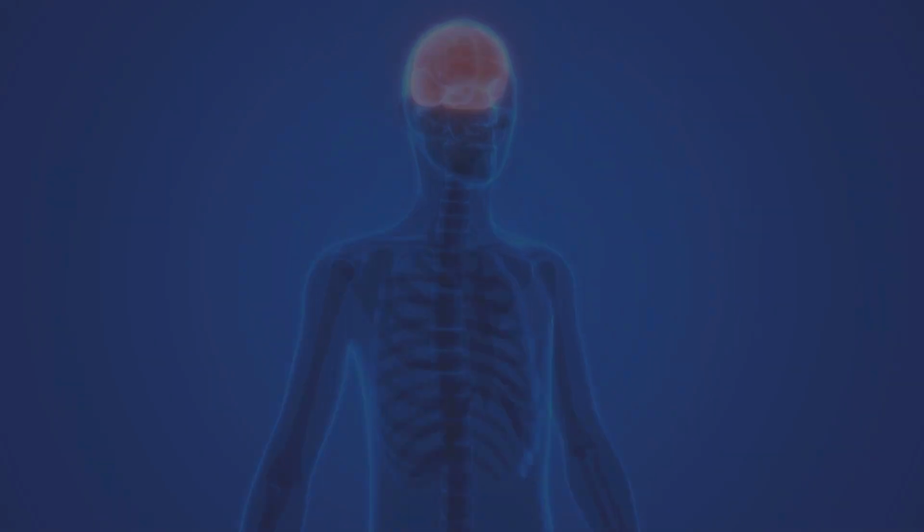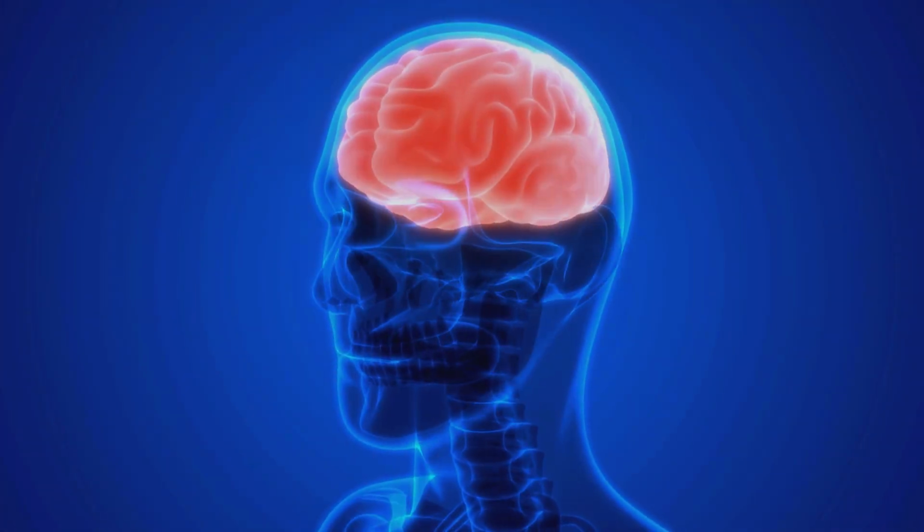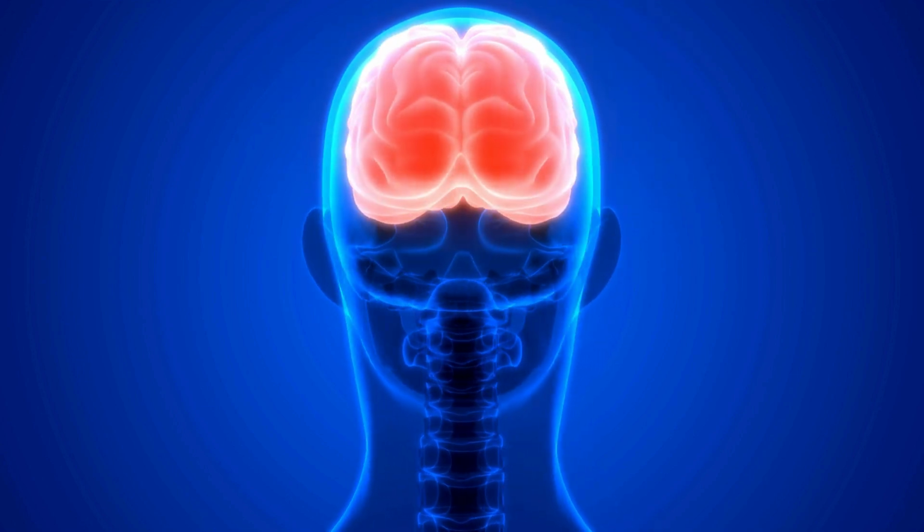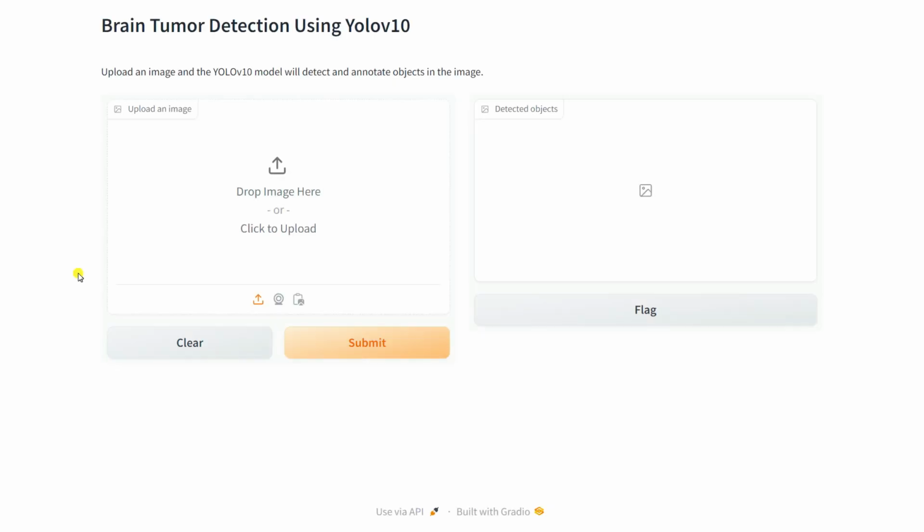In this video, I am going to be discussing brain tumor detection using YOLOv10 custom object detection. So let's have a look at the demo application. So this is our demo application.